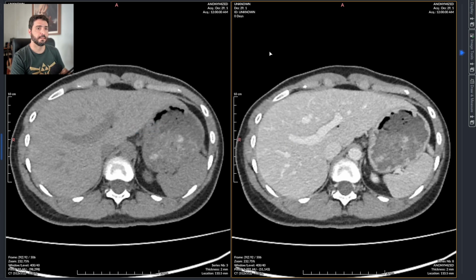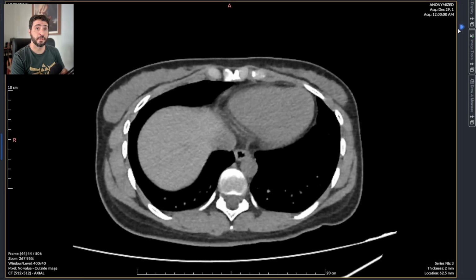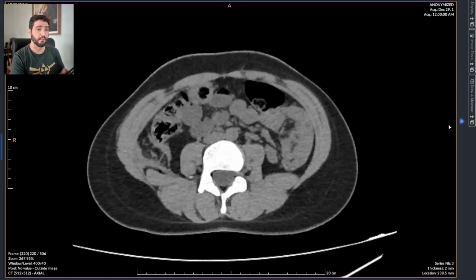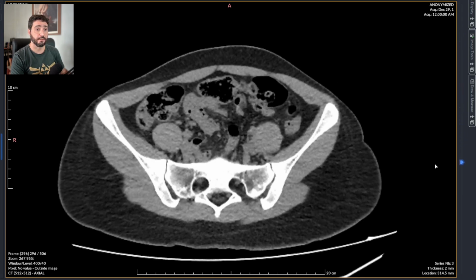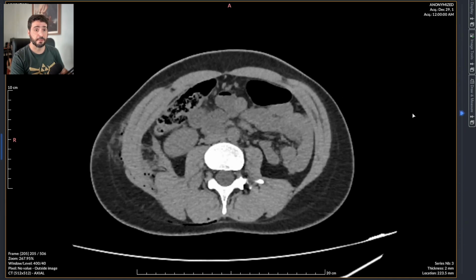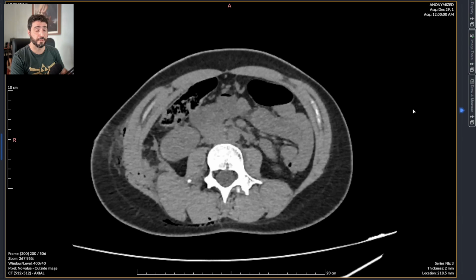So let's see what we can find. It's a gunshot wound to the abdomen, and the doctor said that he could see both the entrance wound and the site where the bullet got out of her body. We won't be able to see a large metallic gunshot fragment, but we should be able to see two sites of soft tissue laceration. It may be some other kind of laceration.